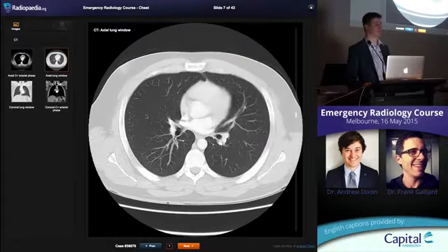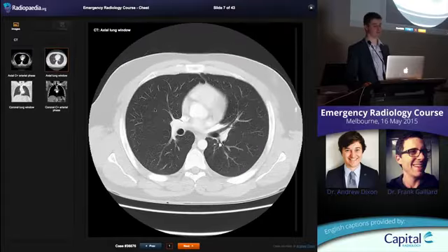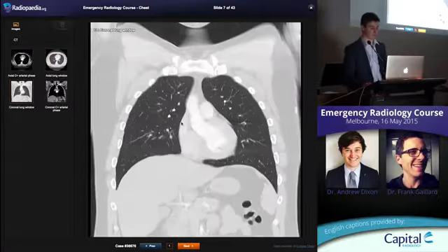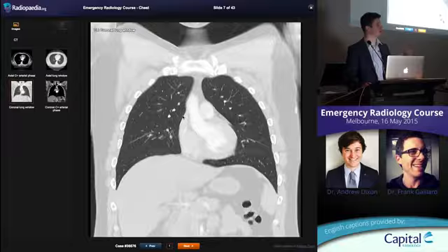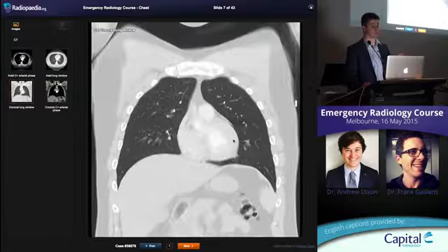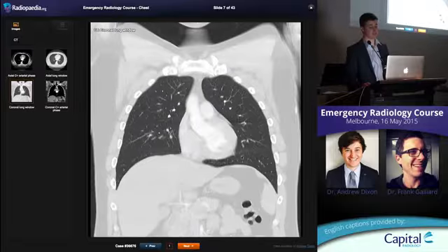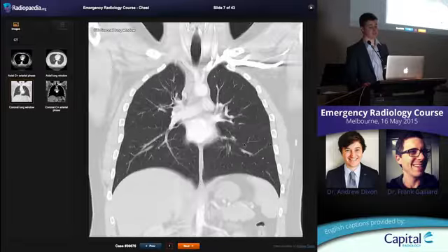That one coming through there is going to be the horizontal fissure. All right? But if you look on the coronal images here, you're going to see exactly why and how we can localise things. Okay, so this is the upper lobe here, lingular portion sitting right next to that left heart border. As we come back, see the oblique fissure coming up? So this is lower lobe.